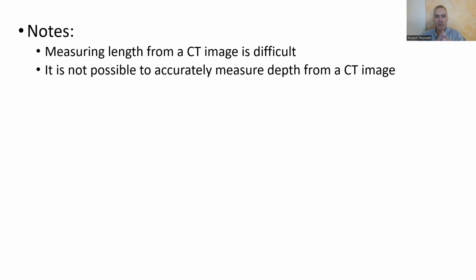And then secondly, before we look at these, it's not possible, according to Stanford, to measure the depth from a CT, not even to estimate. You can't really know an accurate depth. You can see if it's super deep. You could see, okay, that's really, really deep. But it's hard to get an actual number of centimeters or millimeters from a CT.